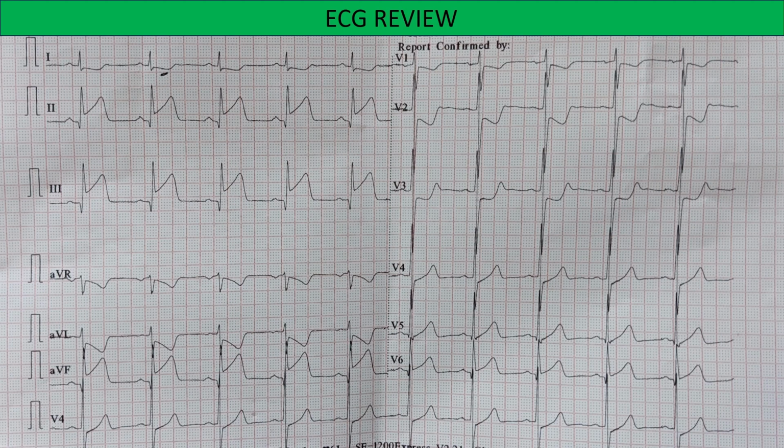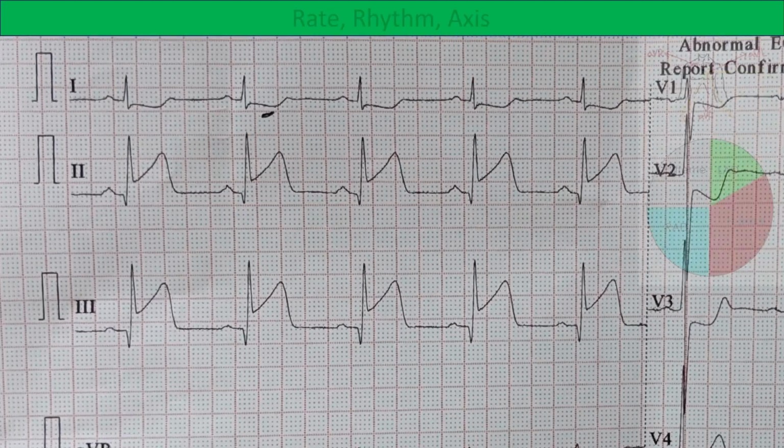Today we have an interesting case of a 42-year-old female with a massive STEMI. Let's begin with the standardized system of rate, rhythm, axis, hypertrophy and infarction. We'll start off with the first three.